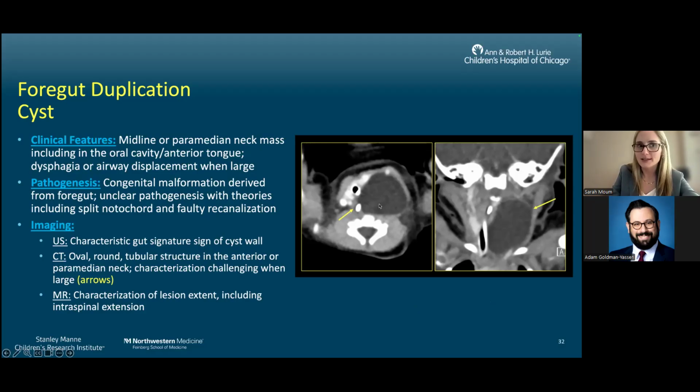For example, was this case involving the thyroid? It's certainly displacing it. But again, any large lesion in a baby can be hard to further characterize. MRI can help with some of that, but this ended up being a pathology diagnosis. And then complications: truly, there shouldn't be many if you get complete resection. Okay.